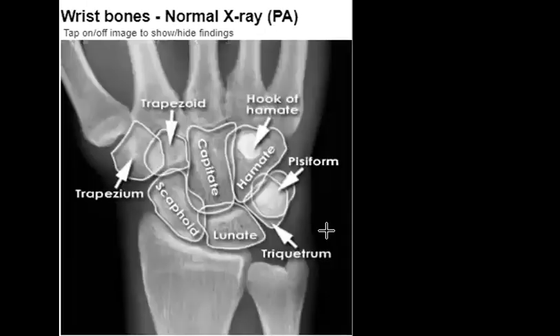Finally, we reach the wrist, and today we'll finish the upper limb. And sure, I know that you know the anatomy, but let's revise. This is the scaphoid, lunate, triquetrum, and pisiform, and the hamate and the hook of hamate. And remember to look at the zigzag line, if you remember from last time.